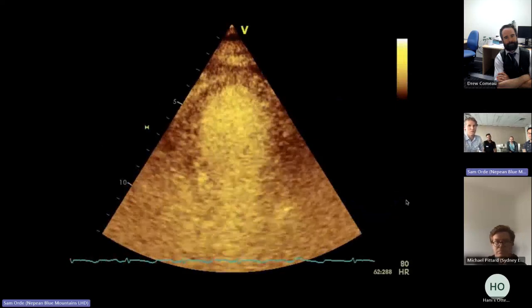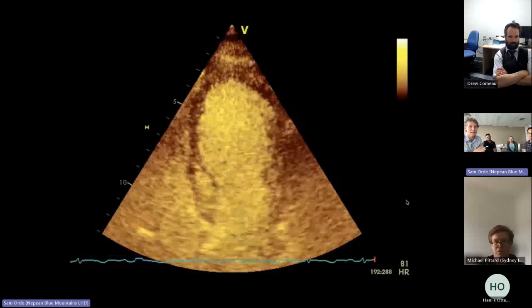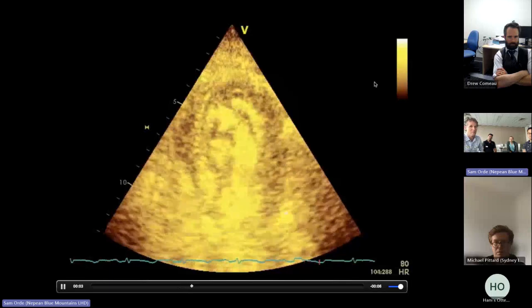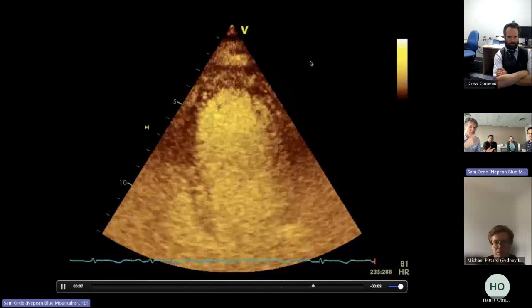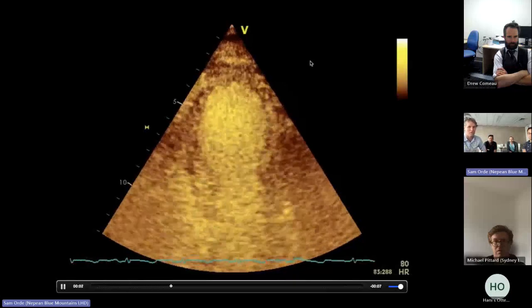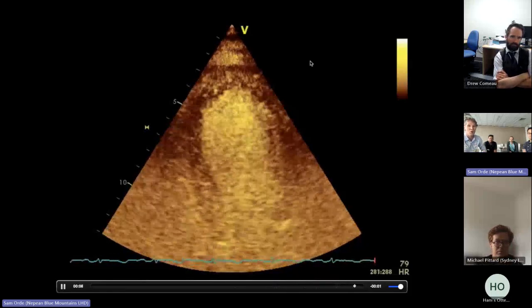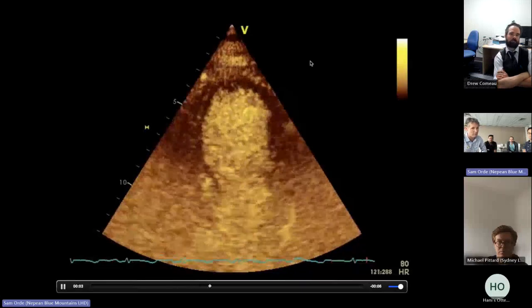This is this lady. So this is what her heart looked like, burst of high intensity ultrasound, and really clearly you can see little bubbles appear in the part that's akinetic. I'll let it run again and just watch little bubbles, they're right there, and they come back in within 5 cardiac cycles. And you're like, man, there's bubbles in there, right? It's not perfect, I don't know, but I think that shows that you've got normal coronary arteries, and this lady looks like she's got a stress-induced cardiomyopathy, and sure enough, she did.